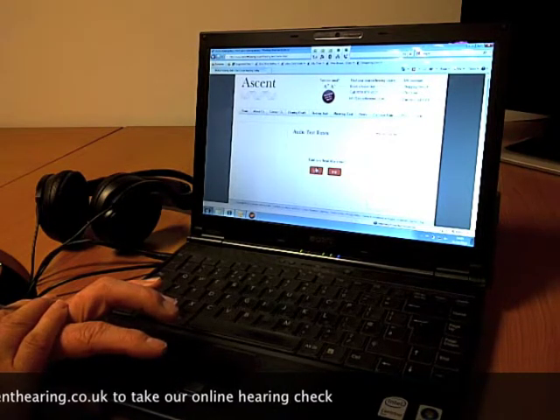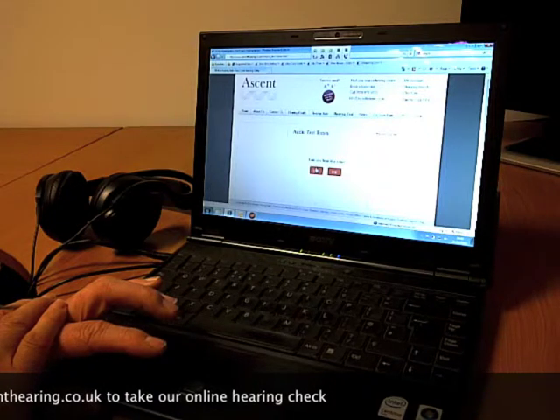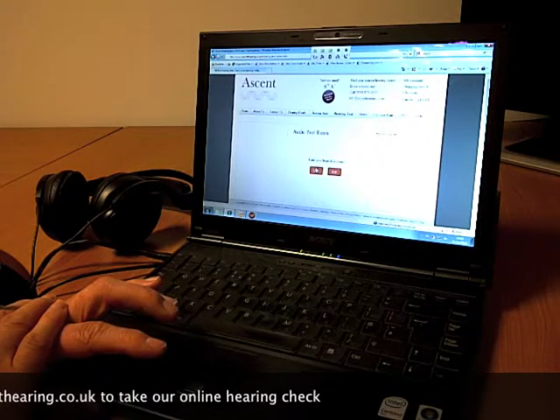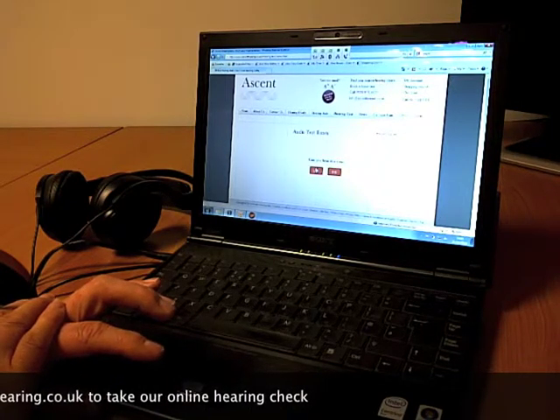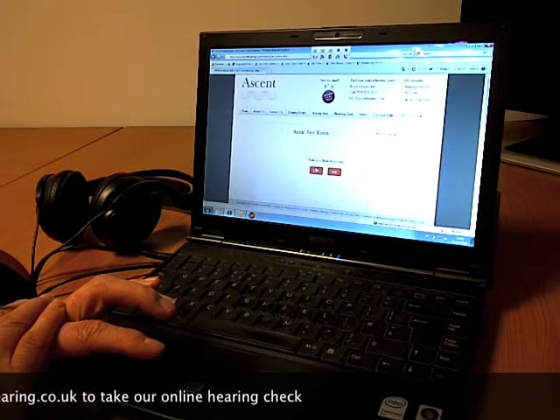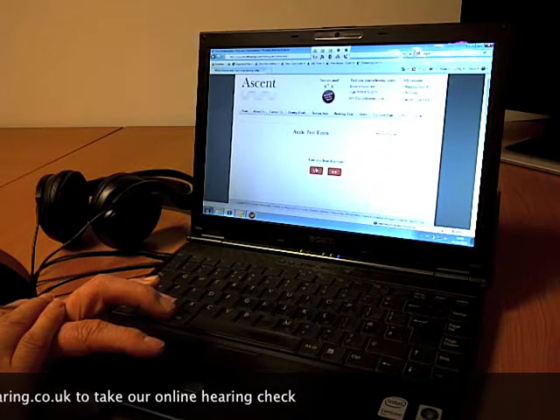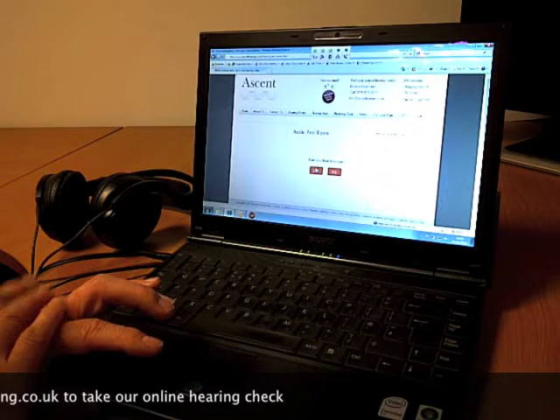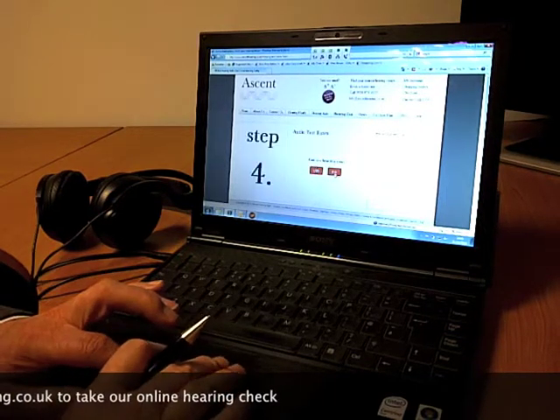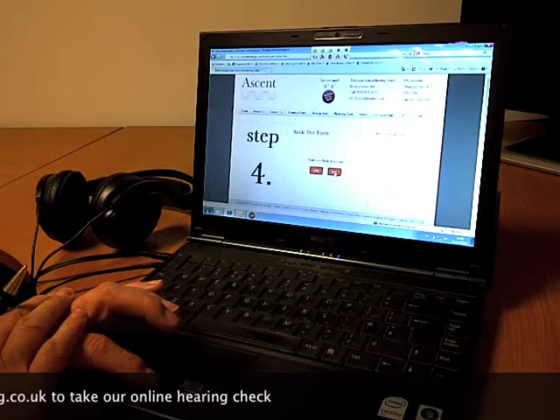I'm now waiting for the higher frequency tone. I hear it, I click yes. And finally now I'm waiting for the very squeaky high-pitched tone. I'm not hearing that one either, so I click no.